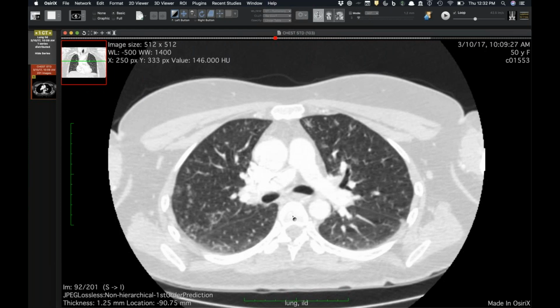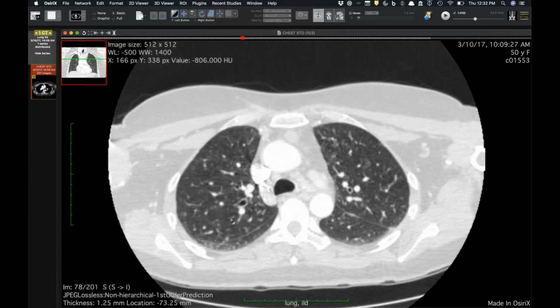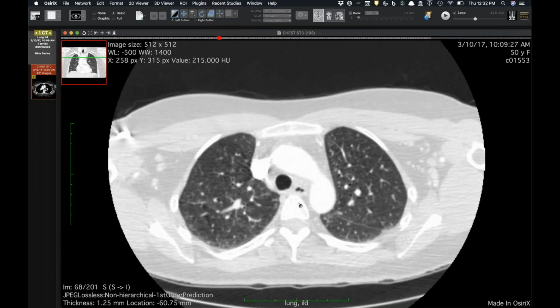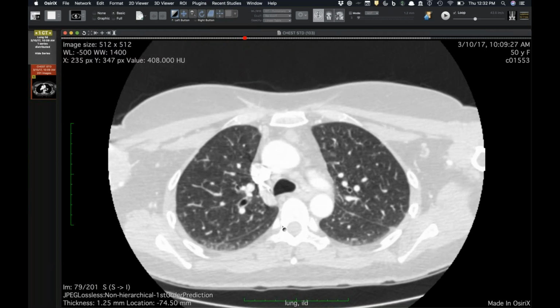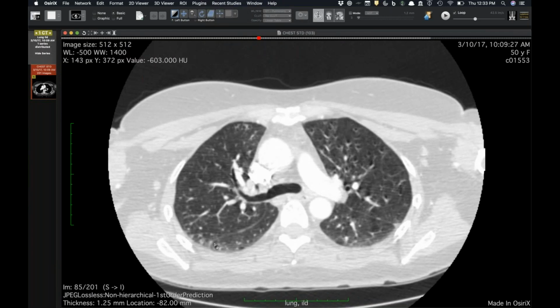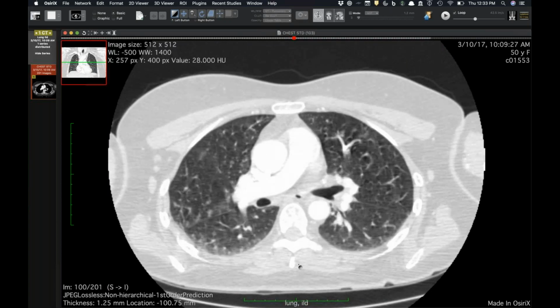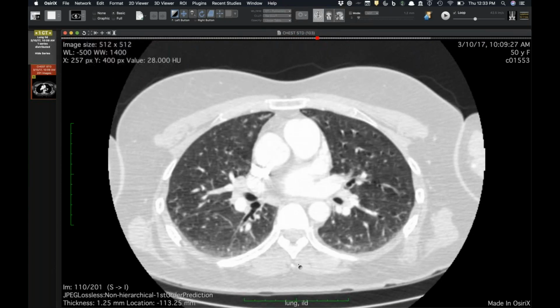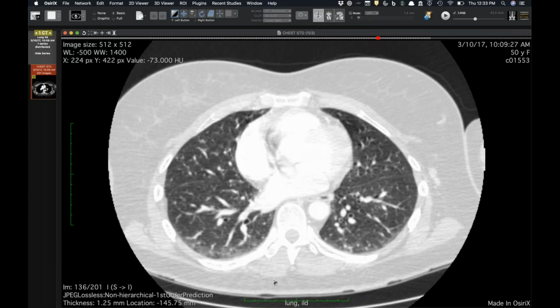What's kind of interesting about her, because it is kind of subtle, she does have some nodules that are mostly centrilobular, but this all happened when she went to Japan, stayed in what she said was a very dirty hostel, and then came back and started having respiratory symptoms. She's been put on a macrolide and then has improved, but the nodules haven't really gone away. So they're still not sure if this could be some sort of post-infectious thing or what else it could be. But there are little centrilobular nodules suggesting a cellular bronchiolitis, and then they did an open lung biopsy and showed that this was follicular bronchiolitis. So at least at this point, presumed idiopathic.